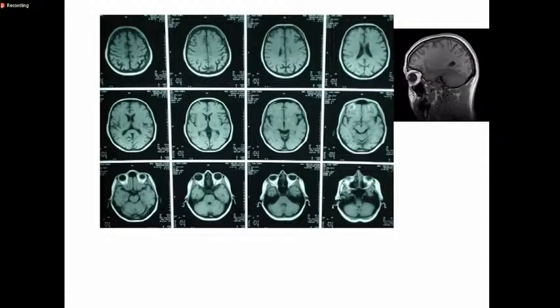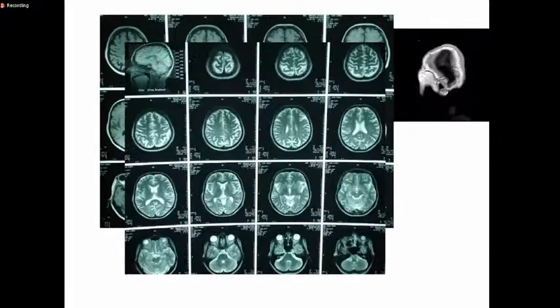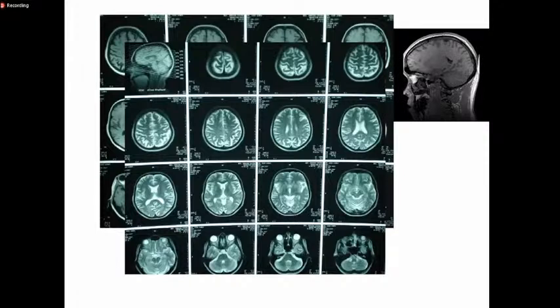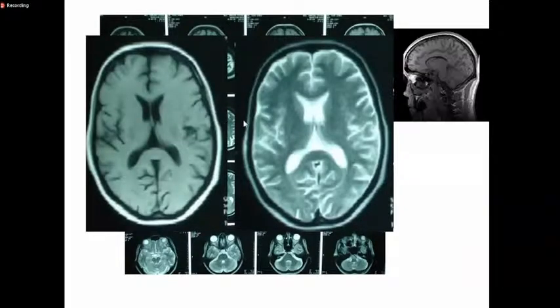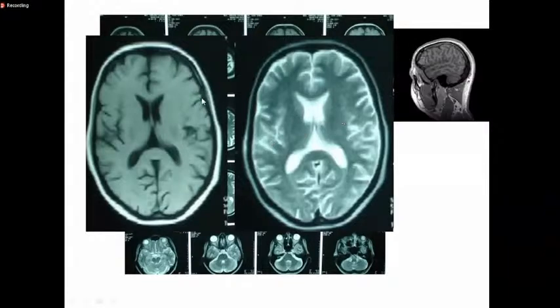very good images. Now, the one thing that MR may have as a mild disadvantage is that you have got to look at very many sequences. Now we talk about T1, we talk about T2, we talk about FLAIR, we talk about diffusion weighting, all those modalities. The most common ones used here would be T1 and T2 sequences. This is a T1 sequence, this is a T2 sequence. And really, this is like a reverse of it.